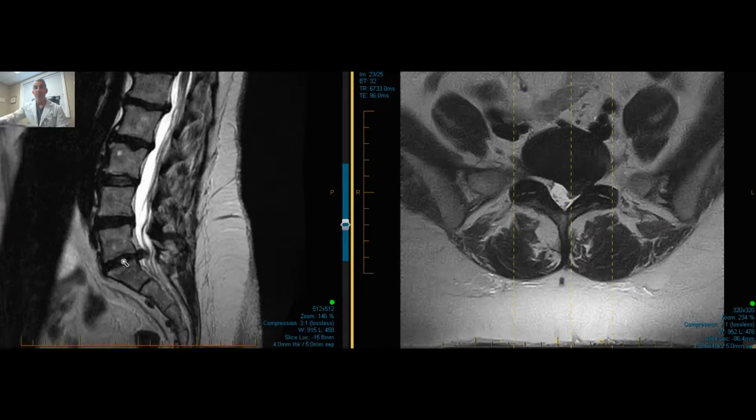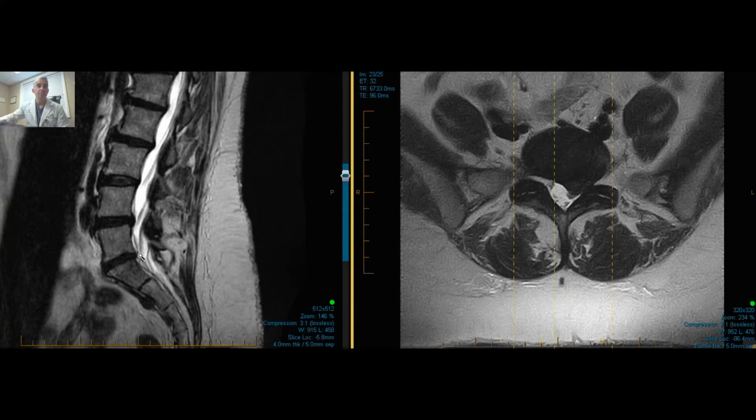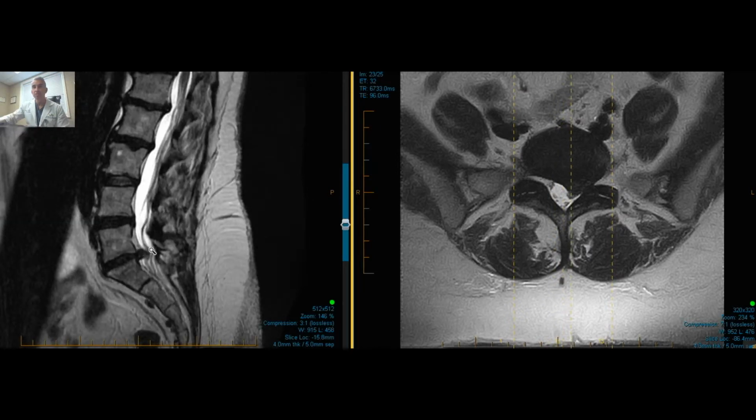So this is the herniated disc. This black disc, as you see here, is now all the way out into here. So a piece of this has traveled this way, and you can see obviously these nerve roots are sort of taking detours around it. This one probably detours around the other side as well. So it's actually causing an impingement, or hitting the nerve itself on that one. If we pan to the right side, you don't see any such thing. It's not coming in. The nerve roots seem to go down just fine. Centrally, right down the middle looks good. Come to the left side, trouble. So that's the herniated disc on the sagittal view.